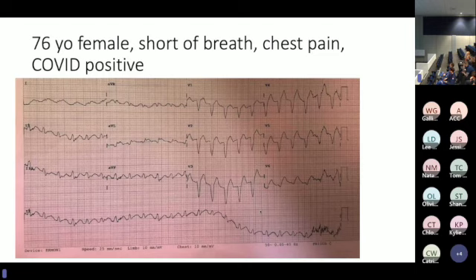Yeah, exactly. So these are tricky ones to discuss with cardiology, because they're sick and unwell, and then they've got these changes. And this actually was a dynamic change. The first ECG was okay, and then it progressed to this. There was a lot of back and forth with cardiology, and there was a bedside echo, and the patient ended up not going to cath lab and going to ICU with a presumed myocarditis diagnosis. They did go to cath lab a week or two later and just had a very small ostial lesion.